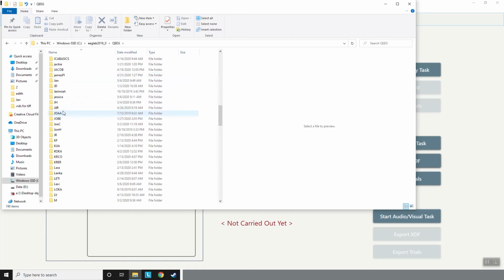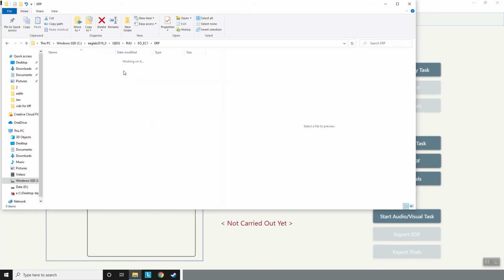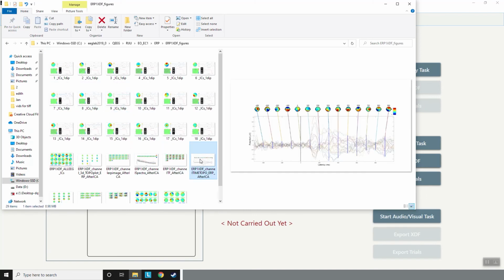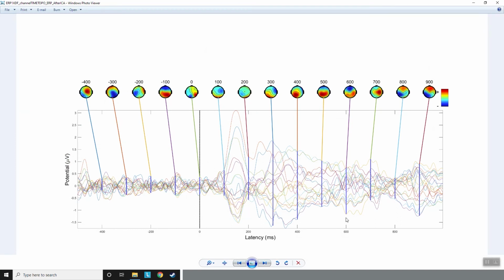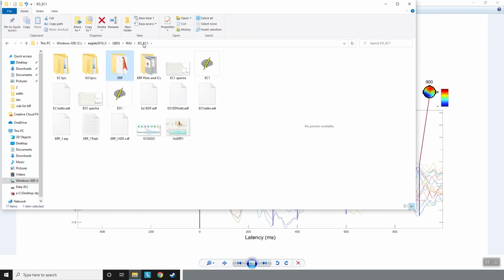And let's see, let's choose somebody here and give you a brief look at what that looks like. So when a person starts a task, they start initially. This is what a compiled EEG ERP looks like, and the 0 is the actual visual stimulus. And then you can see the potential responses when they first saw the object, and then how the brain responds here. Now what we see here is what's called a wide tail. This is a lot of latency or slowdown in the ERP processing. As treatment goes on, then what you start to see is a change in a person's ability to respond.